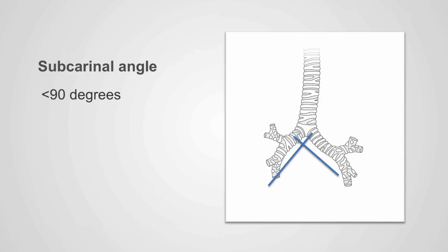Now we have confidently identified the trachea and the bronchi, which represent important landmarks. Having this skill, we can apply this by identifying the inferior border of the mainstem bronchus. We can follow them superiorly, and where they intersect, they form the carina. The angle of the carina should be less than 90 degrees. This is an easy landmark to identify and also is a sensitive landmark for pathology within the mediastinum.